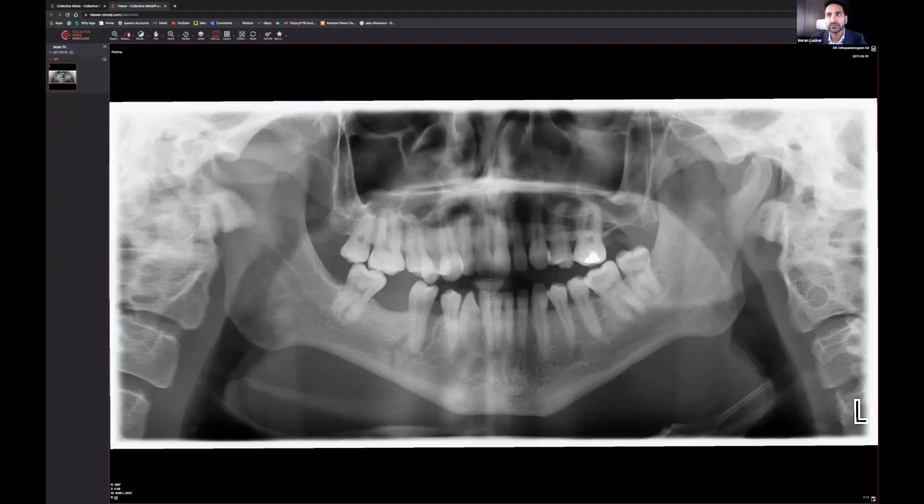Now, something that people don't often talk about is the teeth themselves. What I generally do is draw a line down the middle, and then you count 1, 2, 3, 4, 5, and there's a missing tooth here, and then you've got your molars all the way, and you should have about 8 going across on each side. If you want to talk about a specific tooth, you use this number system. This is the right side, the lower jaw, and you're talking about a third, so you'd say right lower third tooth. For the left lower third tooth, you say left LL3, going 1, 2, 3. That's how you identify which tooth you're talking about.